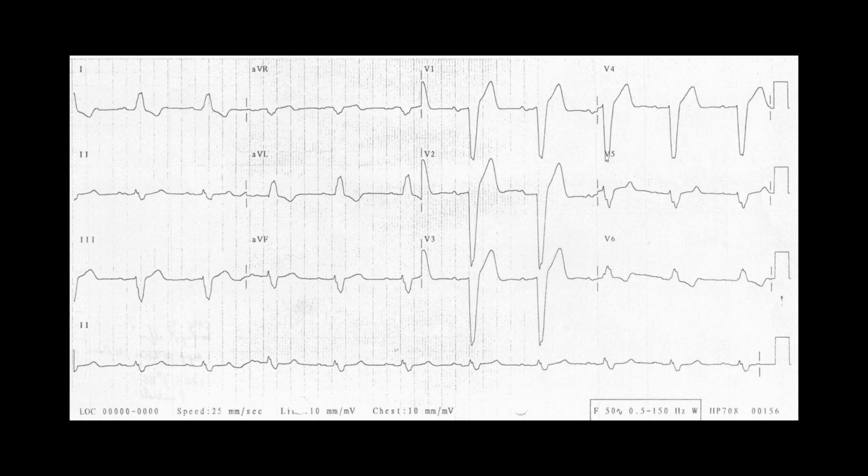So you can look here, if I'm scanning this, oh, I see some ST elevation in V1, V2, V3, all the way out into V4. But when I'm scanning for that acute MI, there are some ways to tell the difference. The QRS is down in those leads, the T wave is up. That's what I would expect because these are discordant T waves. They flipped because of the abnormal depolarization, because in this case, your left bundle branch has been completely blocked, and so your normal conductive pathways aren't working appropriately. And so this is what I would expect.